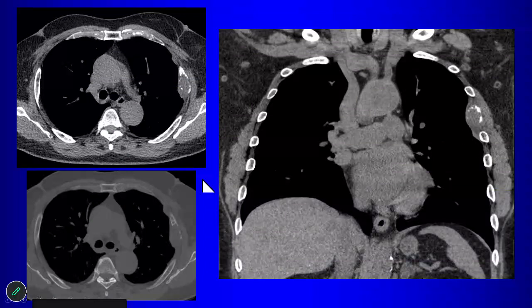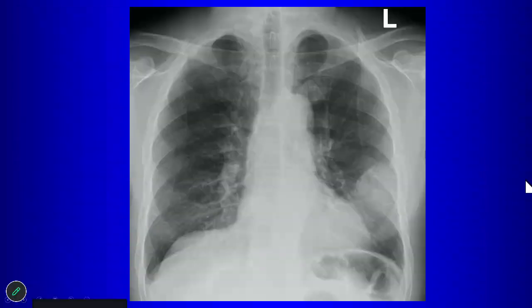So besides any tumor that can metastasize to bone, what else is in your differential for a lesion like this? What could this be? What other kind of cancer or neoplasm? Expansile lesion of a bone, especially a rib. Myeloma. Myeloma, right. This was myeloma. Okay. So if you see a peripheral lesion, look carefully for bone destruction.